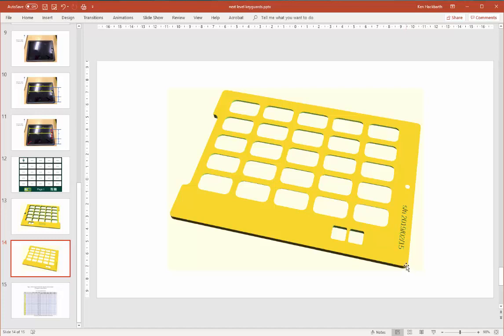That means 00 is here. So my text is going to have an X and Y location in the lower left corner of this piece of text. That would be right here. So it would be some small amount in the X direction and a fair amount in the Y direction. So we'll just try something and see what it looks like.